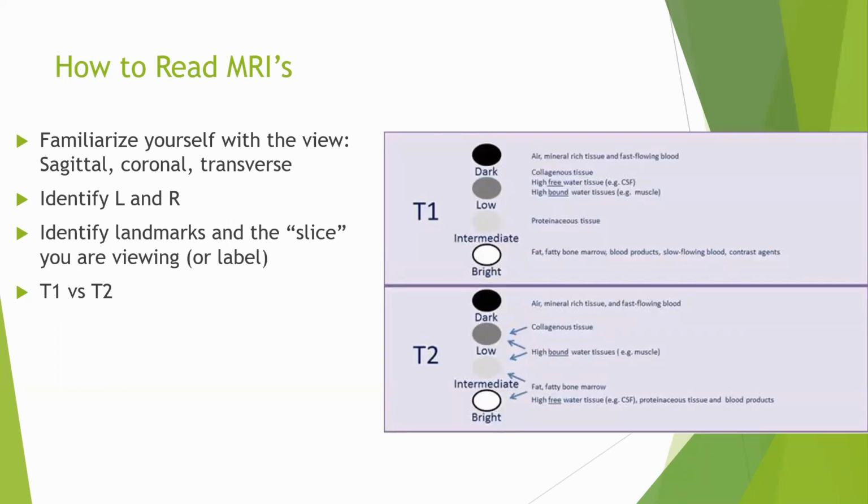When a surgeon wants to do some brain surgery for hematoma and stuff, they obviously need higher resolution, and they might introduce dyes and stuff. All right, so coming back to musculoskeletal practice, you will try to see what you are looking at based on either the top left or the top right, usually the top left, where they can show the lateral view or the transverse view. And then for sure you would know what you are looking at. Is it a transverse view or sagittal view?